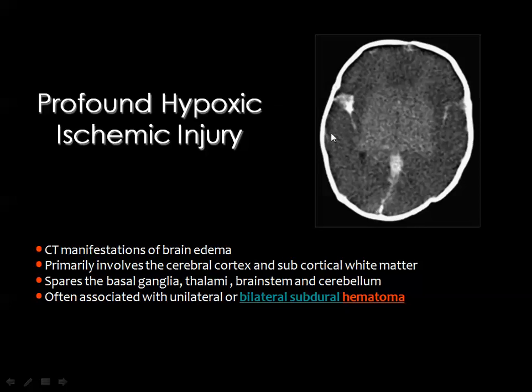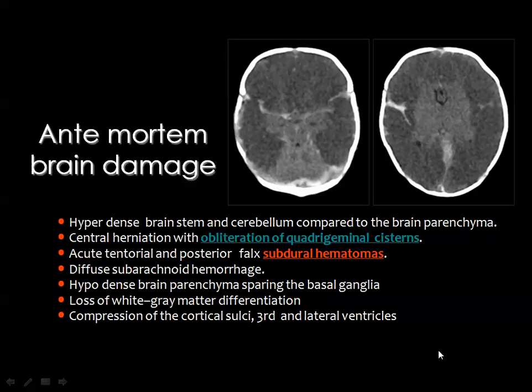And you see here hemorrhage in the sylvian fissure and hemorrhage related to the posterior part of the interhemispheric fissure, denoting its subdural location. And this hemorrhage is actually not secondary to trauma, as was suspected to be in difficult deliveries or so, but this hemorrhage is due to ischemia of the vessel wall, and this ischemia will result in damage of the vessel wall, resulting in hemorrhage.